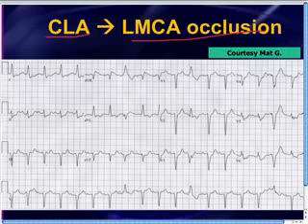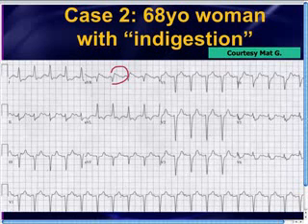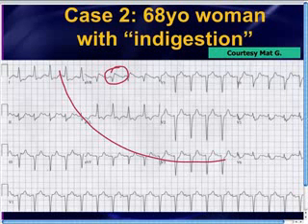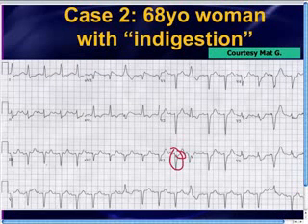Fortunately, the patient ended up doing well. But I thought this was a really interesting EKG, and actually Matt pointed this out for us even before sending it in: the patient has the ST elevation in AVR in the presence of a lot of other ST depression, and this AVR is greater than the ST elevation in V1, and then in the subsequent EKG, there is the loss of discordance between the QRS complexes and the ST segments in those PVCs.